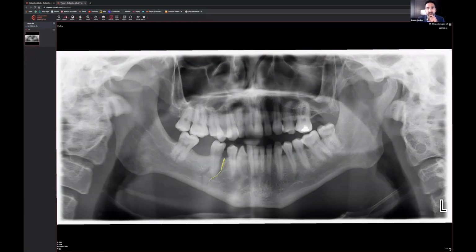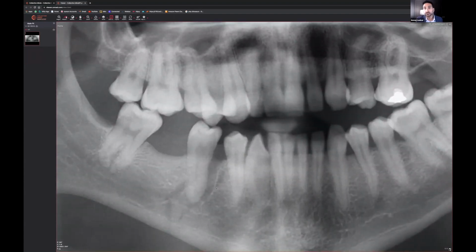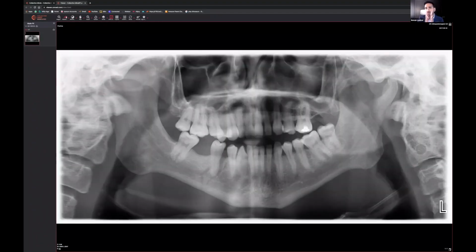But as you go all the way through, you notice that this radiolucency goes all the way down to the edge. Now, this could be a normal structure, maybe, but in the context of trauma, unlikely. Also, there's no evidence of any sclerosis as you come up to the edge of this radiolucency, which increases the likelihood of it being a traumatic injury. If you come up to the edge over here, it's slightly more radiopaque, or sclerotic, but these edges definitely do not look sclerotic at all. So this is more likely to be a fracture of the mandible. Now we've found one fracture of the mandible.